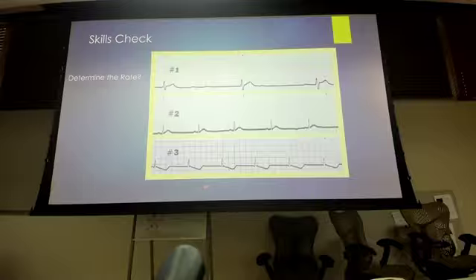What about you? What say you on number 1? So rate. 30. So what do we do? How do we do that? With 6 seconds. And we're timing by 10, right? Okay, very good. Now, could we use the counting method on this? Can't, right? Because we only go to 50 on our counting method, and this is rated 30. All right, very good.